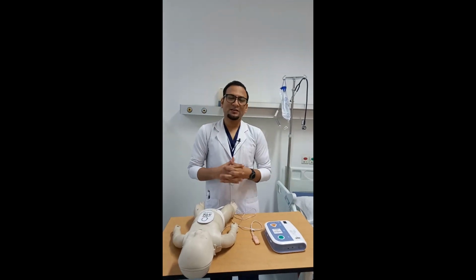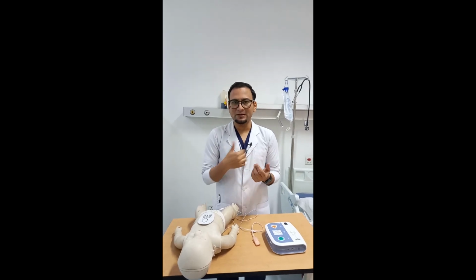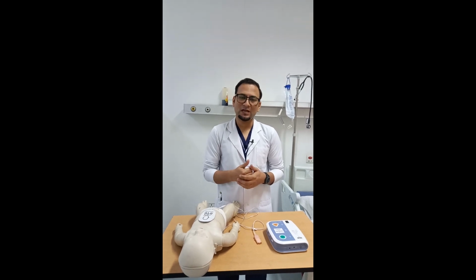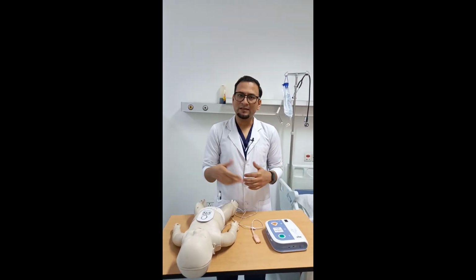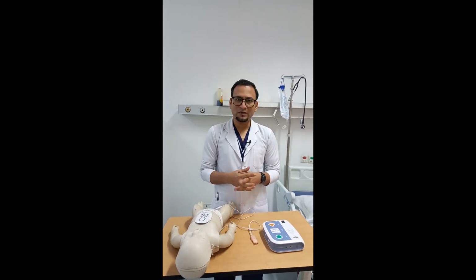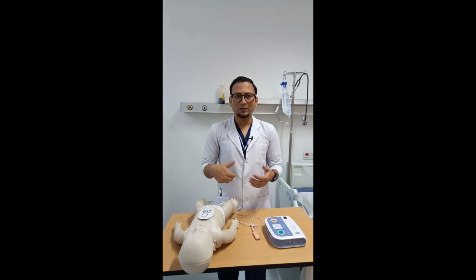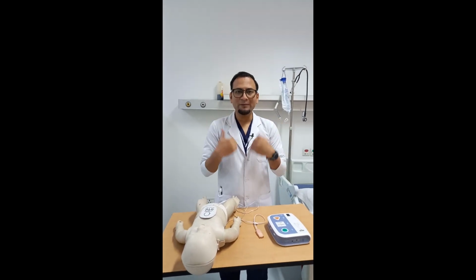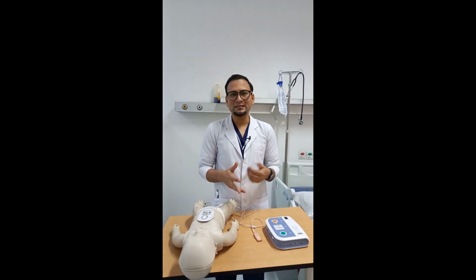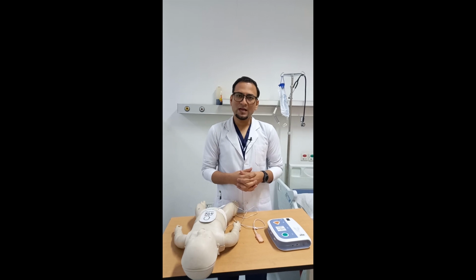In case a pediatric patient is having perspiration in the chest area, we can wipe the perspiration with a white cloth and then apply the AED pads. Suppose there is a drowning case, and the pediatric patient may have water over the chest area. We have to wipe the body of the pediatric patient first and then apply the AED pads. These are certain recommendations we have to follow before the application of the AED pads.